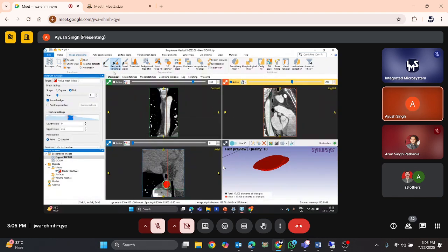A better approach is paint with threshold, where we mark the region. So this was the most primitive approach, used in the initial phases of medical image processing way back in 1996, 1999. Then came the approach of paint with threshold. It was introduced around 2005, with a different set of segmentation techniques. Here we selected our threshold range, marking it from the histogram that we can see. Once this was done, we still had to work on each and every slice individually and mark the region.